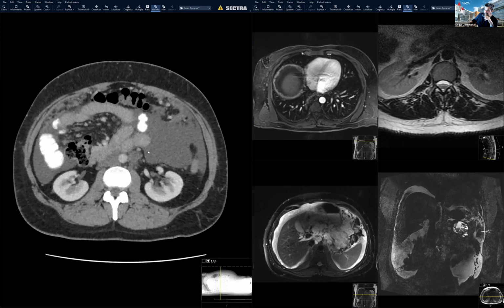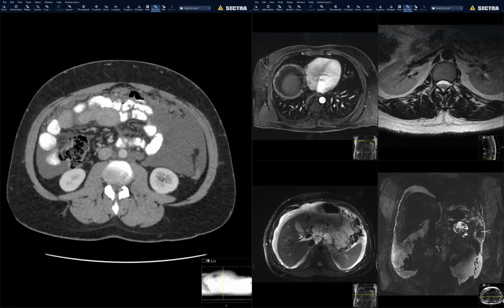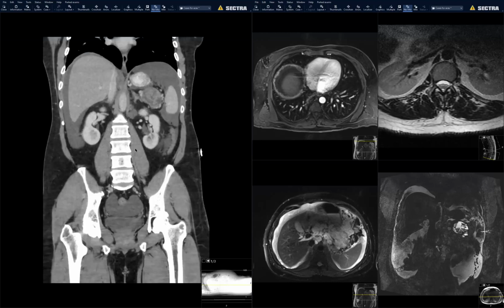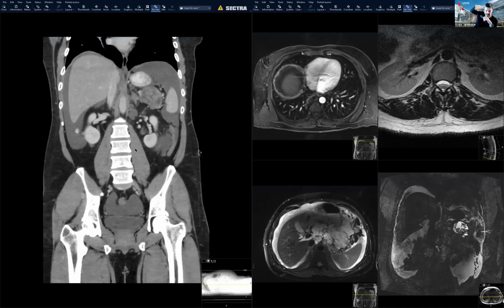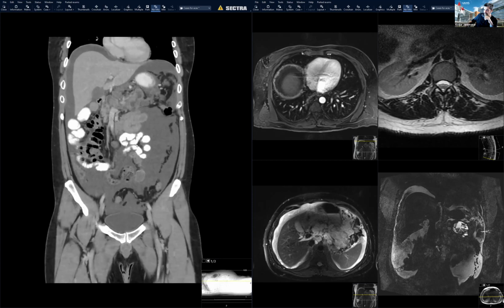So also the other thing is there were lymph nodes, right? Okay. Yeah, so we can think about lymphoma and other metastatic. Okay, so I missed giving one history, which is that the patient had a history of Hashimoto's thyroiditis. But anyway, so this is the coronal.